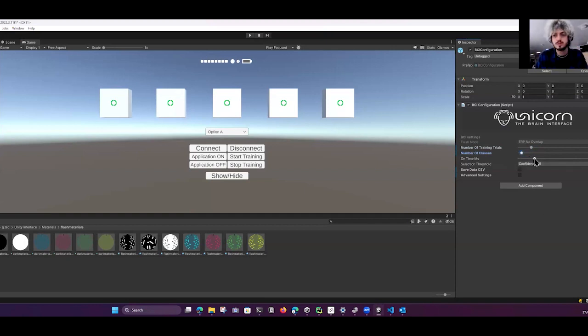And this is the duration of the flashing. So if you lower it, it's going to be faster. If you increase it, it's going to be slower. So this is super fast. This is half a second of flash on, and then the off time is calculated automatically. So you just control the on time.